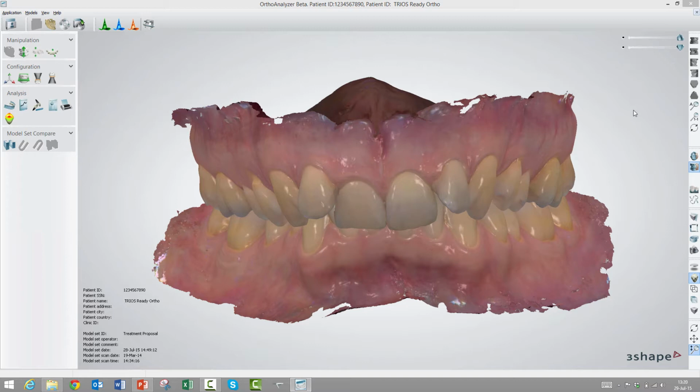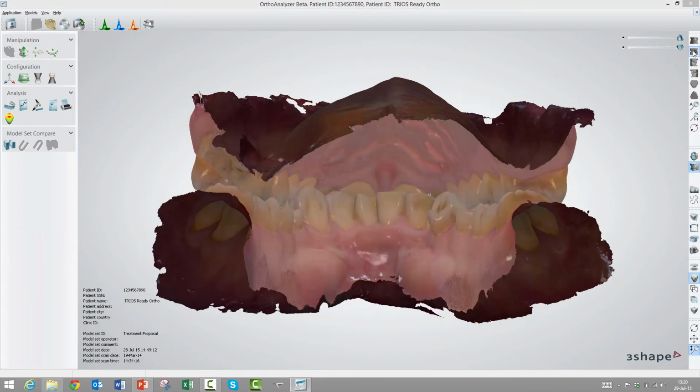So next up is how you use all the 25 tools in the visualization toolbar, and I'll take them from the top. So the first 6 ones here allow you to see your model that you have in the main session window here in a certain angle. They are almost self-explanatory. The first one here is the front view. The second here is the rear view, and you'll see it simply turns around. You could also have done this with a mouse, but sometimes it's easier simply to click on the view button here to get a certain view.